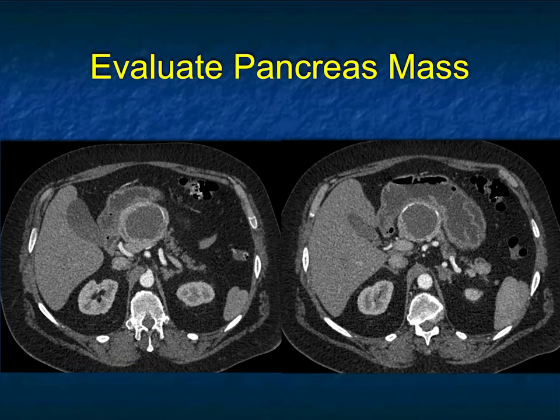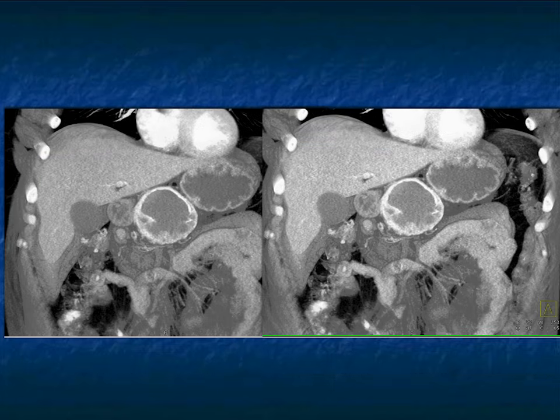Here's another example. Cystic lesion, you could say, could it be a pseudocyst, IPMN, MCN, serous cystadenoma? You notice rim calcification, which still is not that helpful in and of itself, but you notice also there's rim enhancement. So now you give me, and I accentuate it a bit, a cystic lesion, body of pancreas, rim calcification, and peripheral enhancement. I'm going with a neuroendocrine tumor.